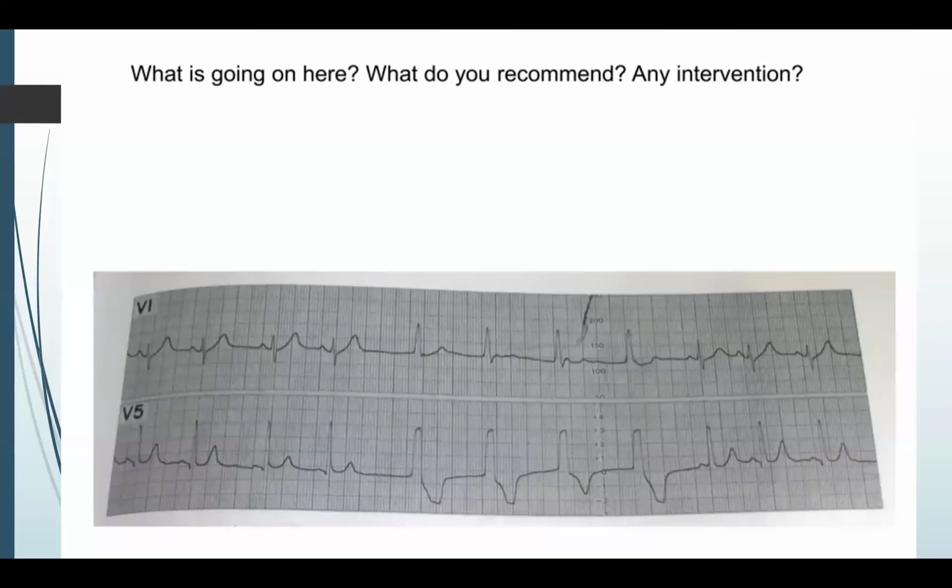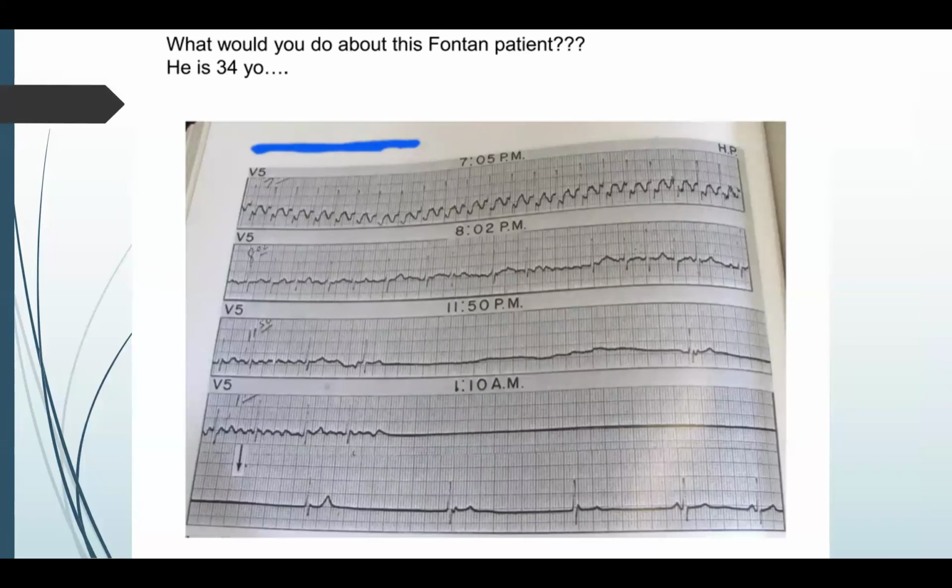Okay. Right. What would you do about this Fontan patient? He is 34 years old, and this is what is seen.